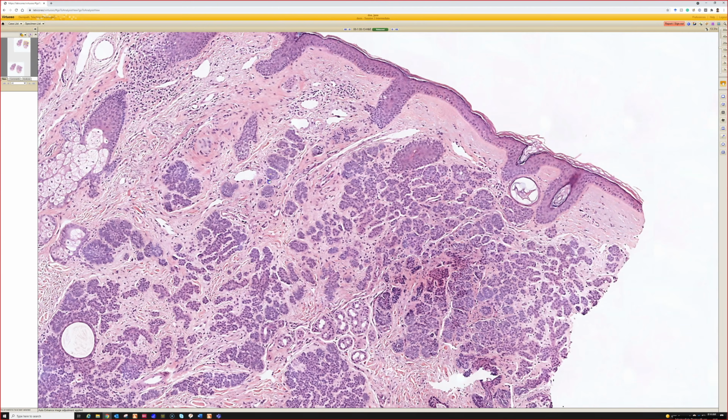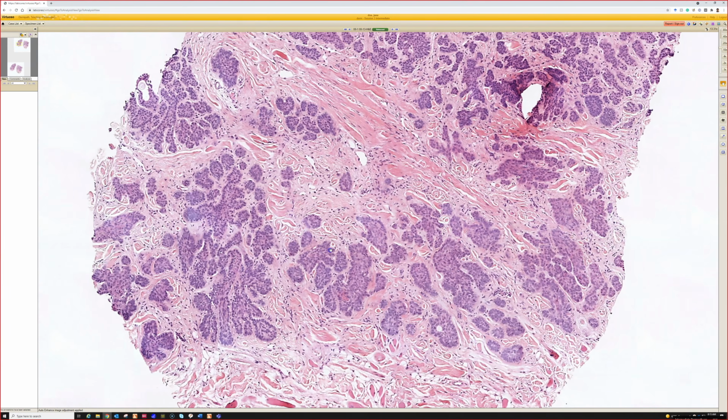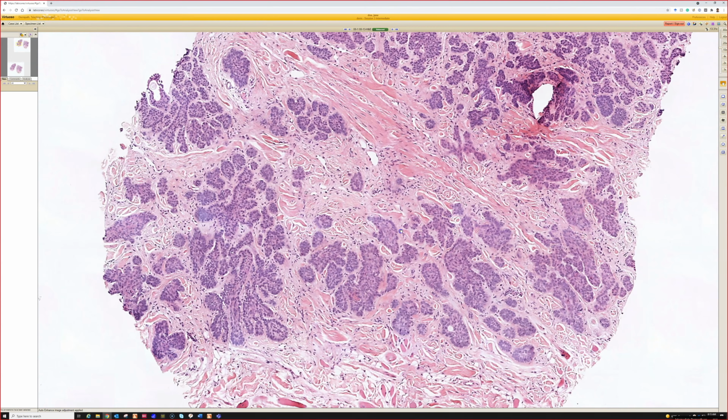And one thing that I will do sometimes in these, if I'm between the two, is do a cytokeratin 20, which in benign hair follicle proliferations, a lot of times you'll have scattered benign Merkel cells, like passenger Merkel cells dotted throughout the lesion. And in basal cell carcinomas, you tend to lose those. And there's a variety of other stains people have done to try to tell apart basal cell carcinoma from basaloid proliferations like benign hair follicle tumors. And I feel like a lot of those are kind of challenging to use. And the reason people have described so many is because none of them are totally perfect.